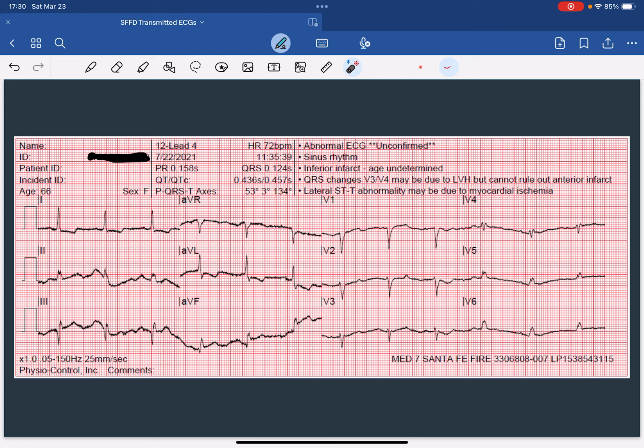And I want to reinforce that just because something looks bad, in the sense that the image that you captured isn't great, doesn't necessarily mean that you don't have the ability to use this information and formulate a differential or even formulate a diagnosis when it comes to looking for cardiac abnormalities.